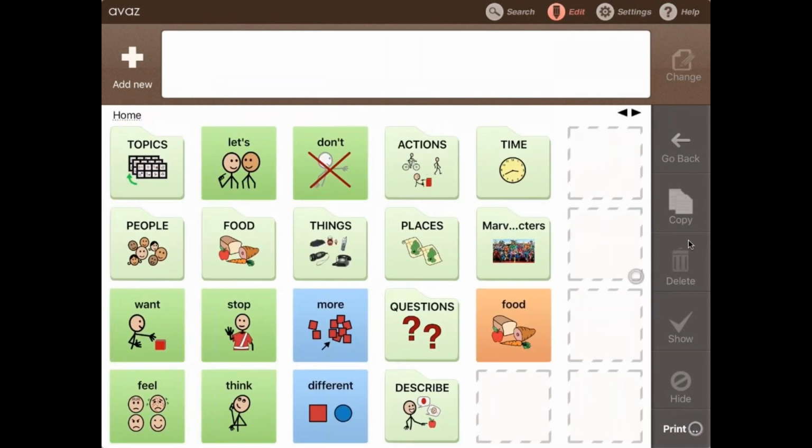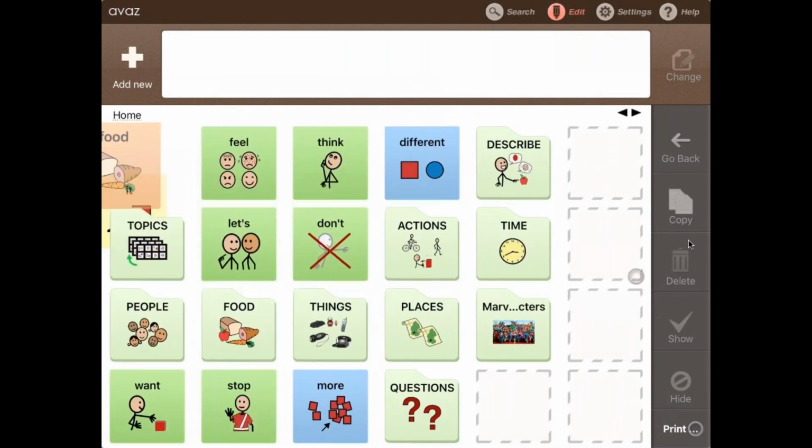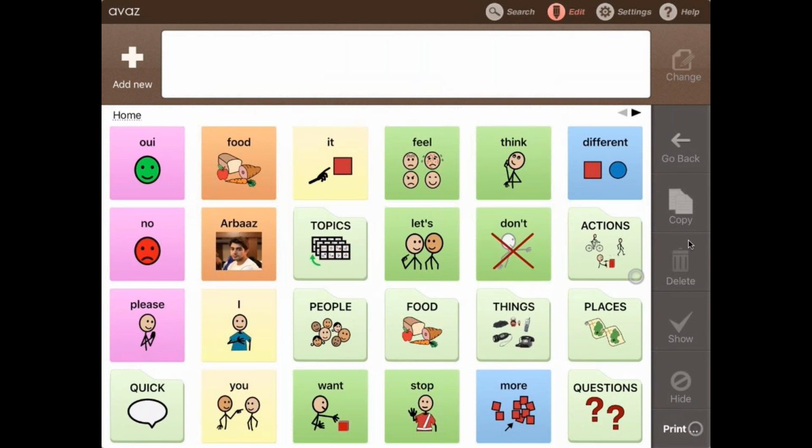After which I'm able to click on it and drag it to the more convenient place that I want it to be. And if I exit this, the word food is in the main folder now. Hope that answers your question. I'm glad to repeat it if you would like it.